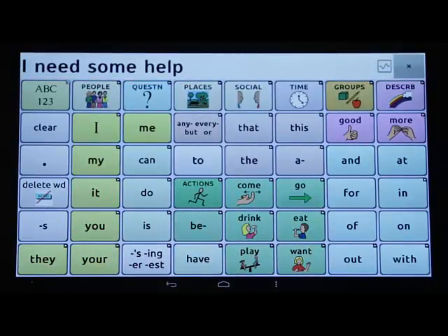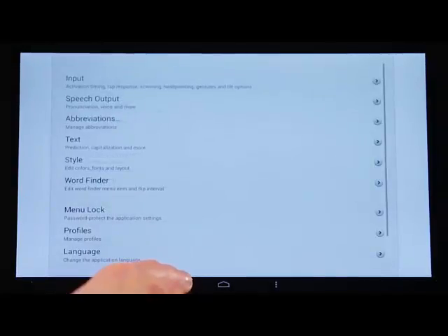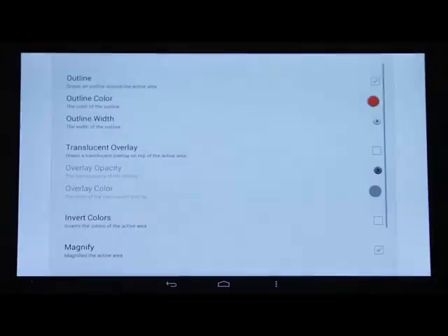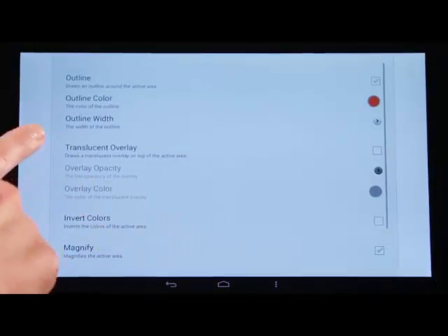Another visual option available is Animate Effects. This will animate the active visual effect. This example will use Word Power 48 with a block pattern.